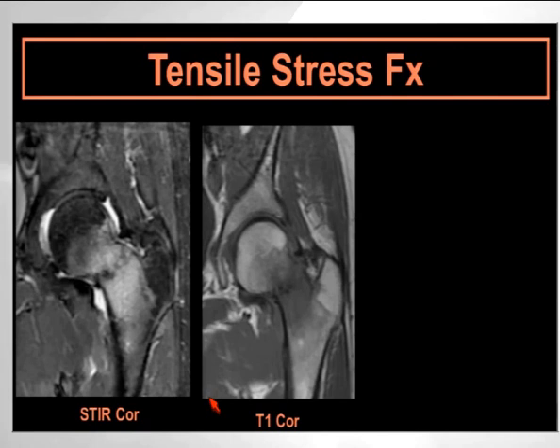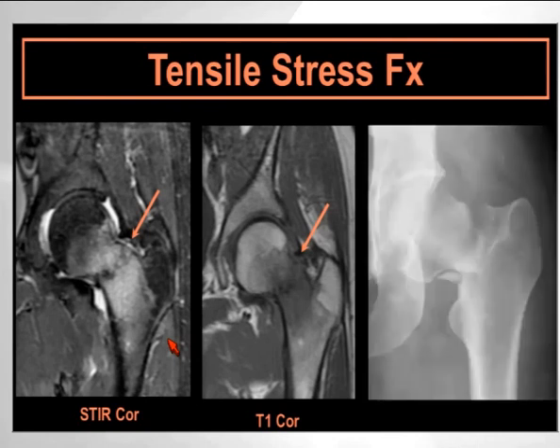Because this particular patient actually came with the disc from an outside imaging center and had this fracture involving the tension-sided femoral neck. By the time we imaged her on radiograph in the ED, she was already displaced. So she's prone to develop AVN because it's a complete displaced fracture. I was told that the day she got this MRI, she was running, preparing for a marathon. In fact, her radiograph was normal a week before, so that gave her more comfort that there is no fracture.